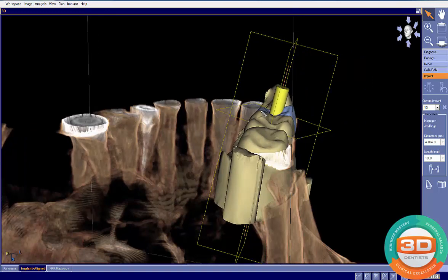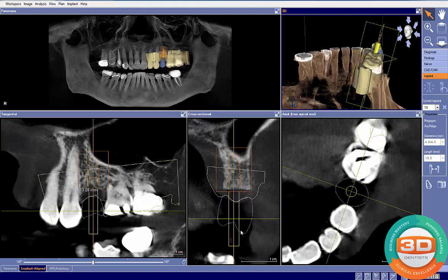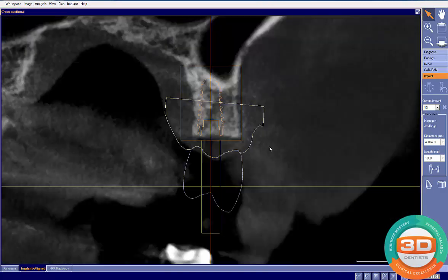What I'm seeing here is that this cusp is higher than that cusp there. So more than likely that lingual cusp could be brought up. Again, I don't know what's going on underneath it and what the status is of that tooth, but my guess would be that we make it not quite angulated right in here. The reason I bring that up is because the way I like to look at this is, if my tooth is angled like that, then I want to tip my implant that way to try to get a more ideal positioning like that.